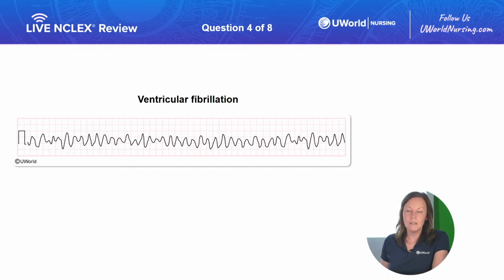The correct answer was option 2, ventricular fibrillation. So when we have VFib, our ventricles are quivering.